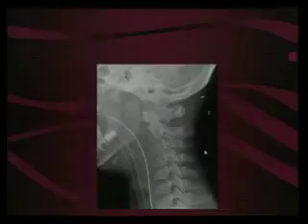Actually, the first thing you need to do is count how many vertebral bodies you got. 2, 3, 4, 5, 6, 7. All right. That's pretty decent for a trauma patient, huh? Okay, so the first thing we want to look at is our prevertebral soft tissues. Well, guess what? He's intubated, so all bets are off, so we're just going to ignore that. Okay? So anterior longitudinal line looks good. Posterior longitudinal line looks good. So the lines there are good. What about our spinolaminar line, this little guy right here? Looks pretty good, doesn't it? What about our spinous processes? They look pretty good, huh?